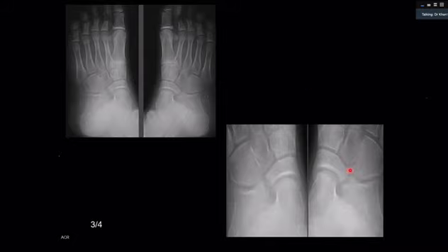Now, do you see any difference between here versus here? This is the calcaneum. This is the navicular. So there is a joint between here. And do you see a difference, this versus this? Agreed or not? Agree. So you can see that this joint space gives you a slightly irregular type of margin. Look at the margin here, and this is very well defined. This is irregular, maybe a bit of sclerosis is there. What comes to your mind?